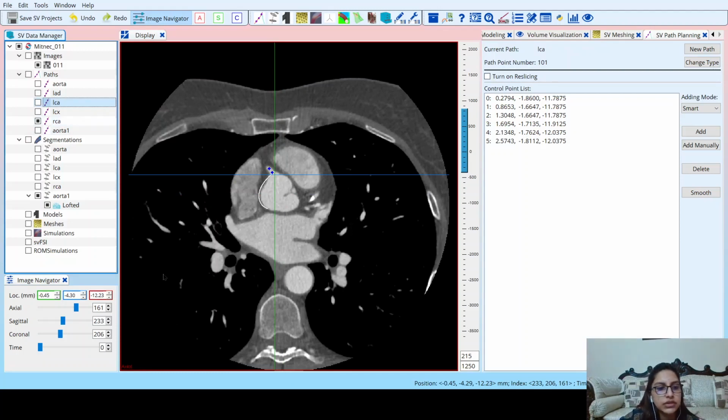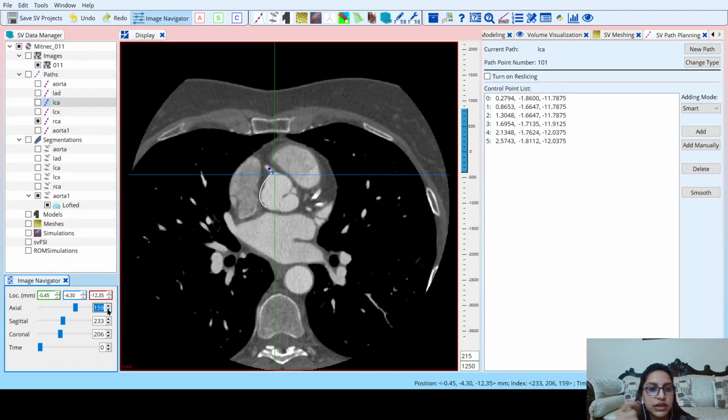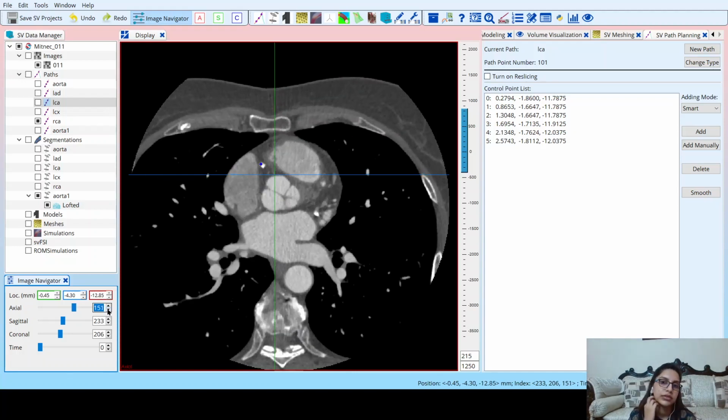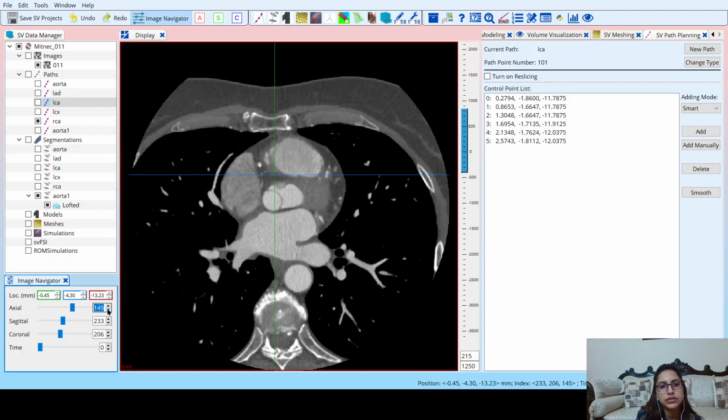And just watch. Now we could also do this in the other planes. That would show us a line or a dot in the sagittal plane. In the axial, look, I've followed the artery till it becomes a point or disappears. You could see the blue point.